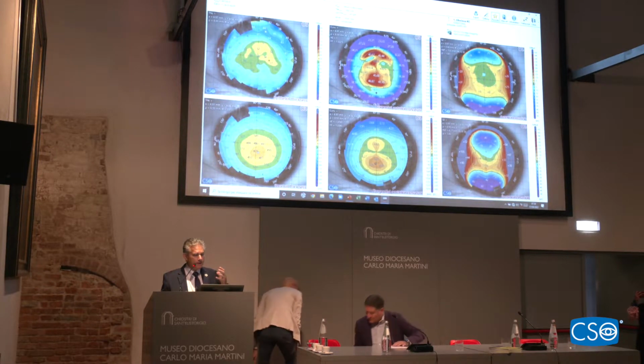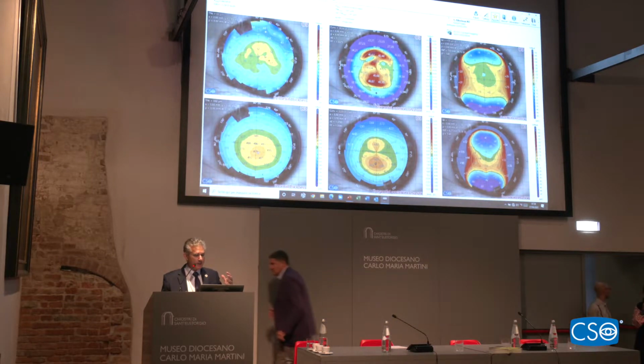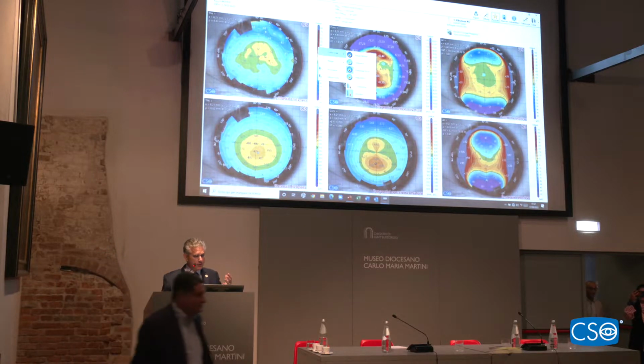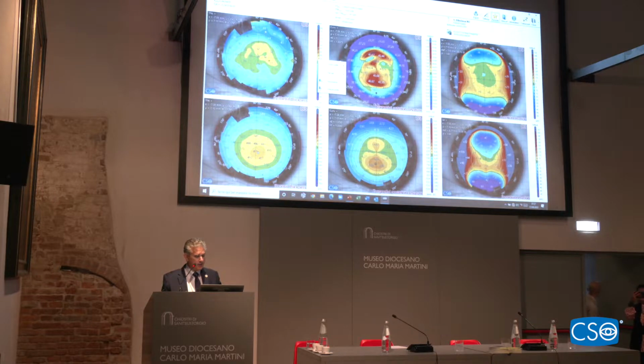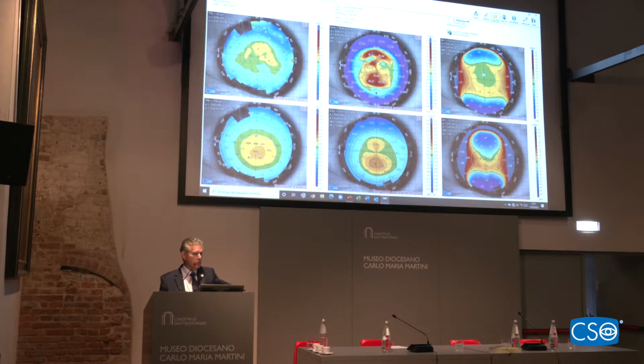And now we look at this map first, the 6 map. I also want to point out that we use the American style scale, and we have all of these overlays put on, because it gives us the ability to look in Cartesian coordinates or polar coordinates for locations of pathology.